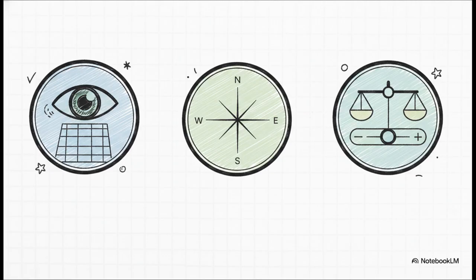Validate your new results in parallel with whatever QA software you're already using first. And honestly, most importantly, never blindly trust a text result that just says pass. You have to visually review those image overlays to make sure the algorithm actually identified the pickets correctly.